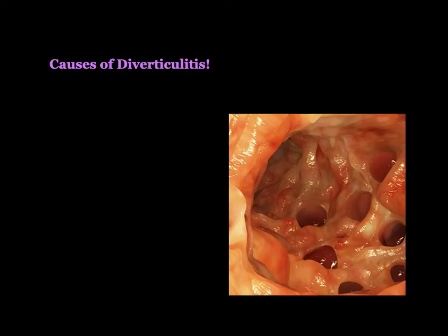All right, so we're going to end our lecture today with one of the most exciting abdominal ultrasound scans and one of the newest techniques that we've been looking at, and this is using ultrasound to diagnose diverticulitis. So we see diverticulitis a lot in the emergency department. Approximately 130,000 individuals are hospitalized yearly with diverticulitis.